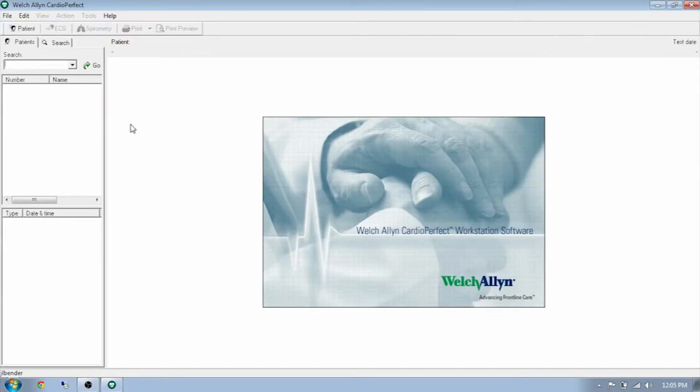Once this logs in, you're going to conduct your EKG or spirometry as per protocol. For today's purposes, we're just going to pull up a patient and go from there. And we're just going to select one of this patient's EKGs to use as an example.